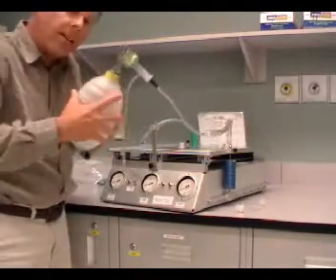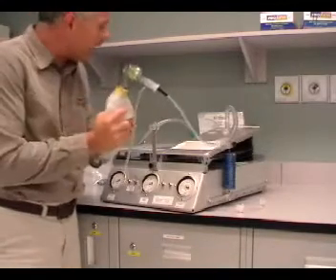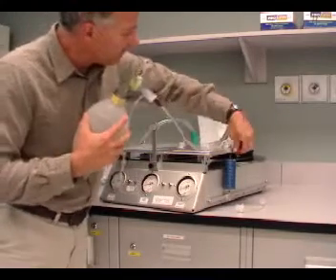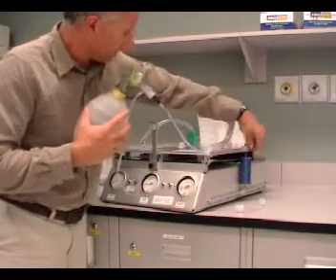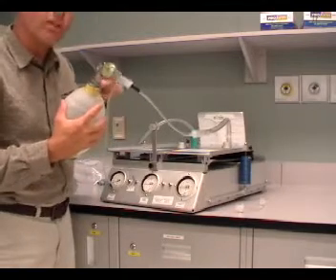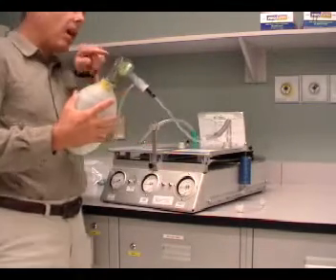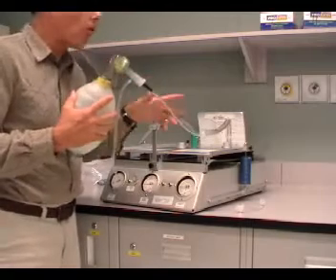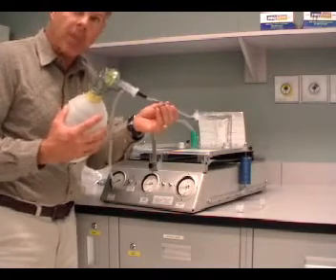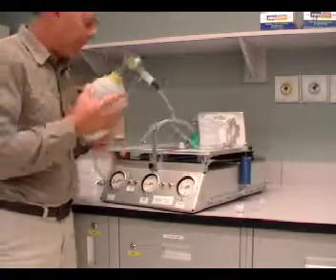So during flow, when I'm actually pressing the bag to get flow into the lungs, you'll see that this pressure gauge is much higher than this pressure inside the lungs. That's because I require force to overcome the resistance of the endotracheal tube. And we'll look at that relationship mathematically in class. Let's take a look at the pressures close up.